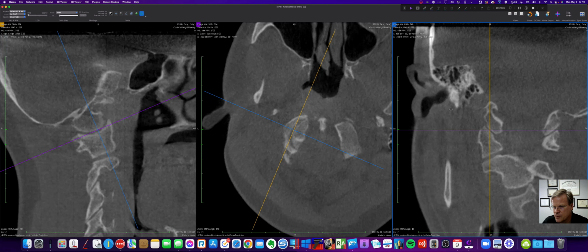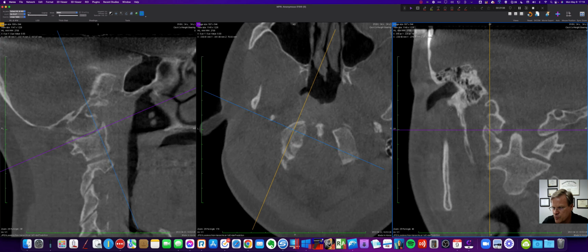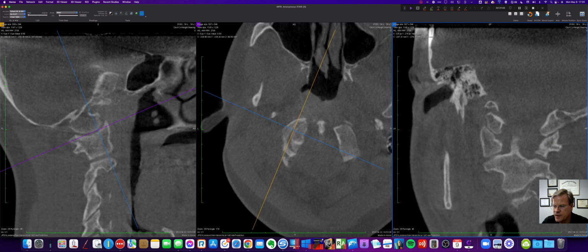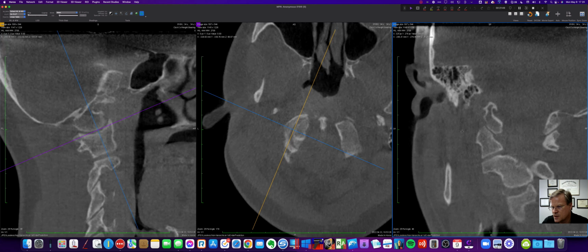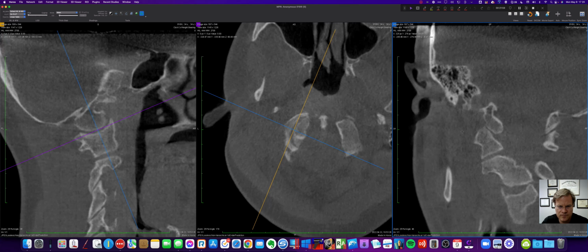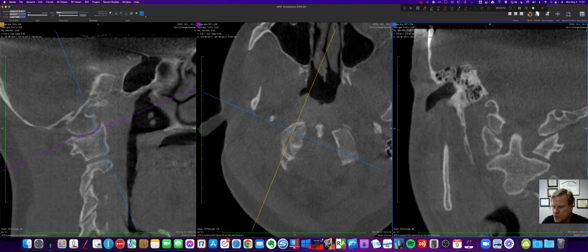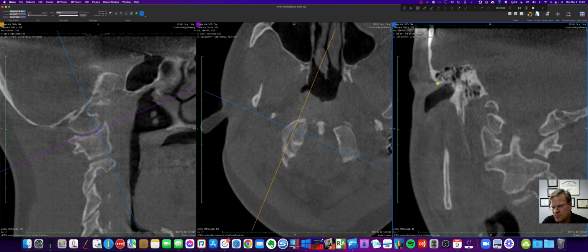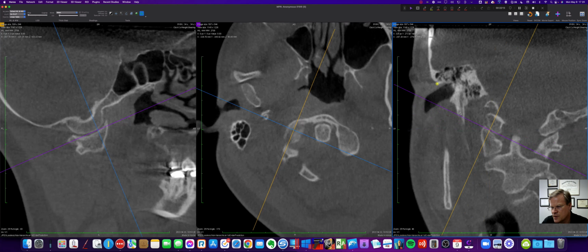Now, maybe I'm too far forward. Let's scroll forward. As we go more forward, we're seeing a little bit of an ASL, which we would expect. That still looks like an ASL. Now we're getting back to the very middle of the joint. Looks even. So the point you want is about in here. So I am thinking it's probably an ASL. Now let's do something else.